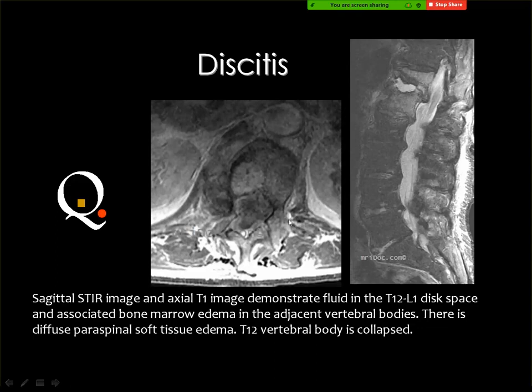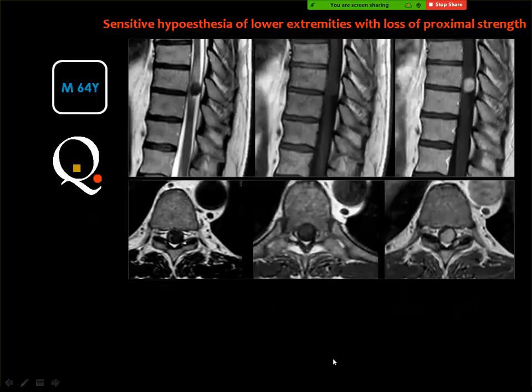You know very well that metastases do not involve the disc; metastatic deposits affect the vertebrae without involvement of the disc. So the differentiation between inflammation and metastasis is easy, but the differentiation between metastasis and a collapsed vertebra secondary to trauma is sometimes difficult.